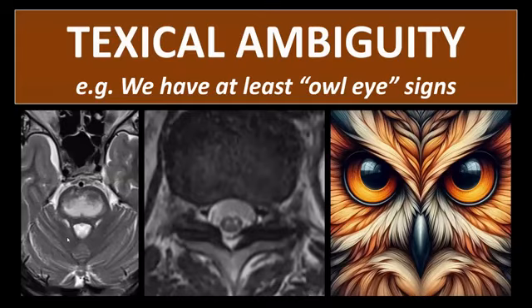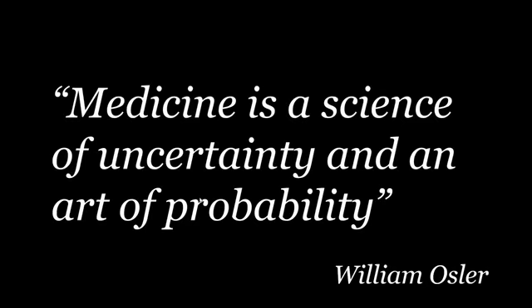central pontine myelinolysis, but, and I didn't add it in the cases because it's more spinal and I try to limit the number of spinal cases, it's also a sign described for spinal infarction involving the anterior horns of the gray matter, and can also be seen in certain infectious diseases of the spinal cord like polio or polio-like disorders. So, okay, let's say that these signs can be helpful, but we should be a little bit critical when we use them.